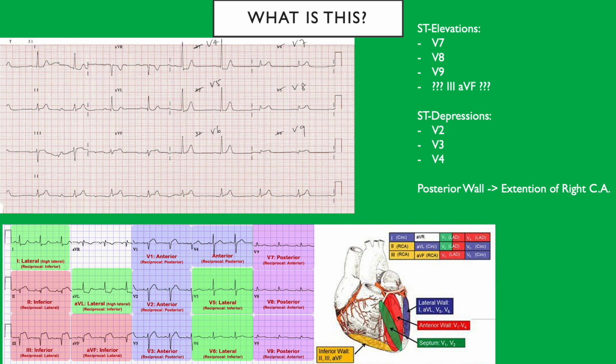Do we see ST depressions now? Suspected ischemia, what do you mean? Like ischemia of the myocardium. So unstable angina. Yeah, I guess. Okay. In that case, we don't see ST elevation. That will be non-STEMI changes. So you have pathological changes, but non-STEMI changes. I'm still trying to teach the STEMIs and depressions here. So we still do the thing, you have to do it by law, legally do it.